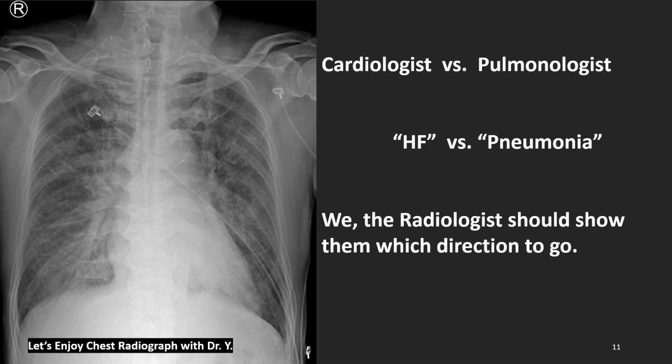Let's look first at this film. What is your diagnosis about this image? There's an anecdote between a cardiologist and a pulmonologist. First, the cardiologist came and watched this film and then said to the others, "Hey guys, this patient must have heart failure."